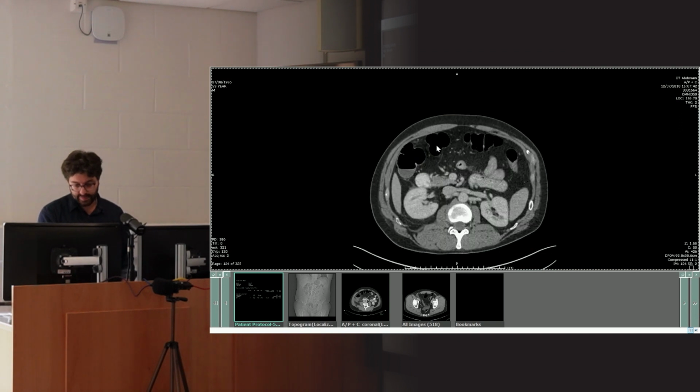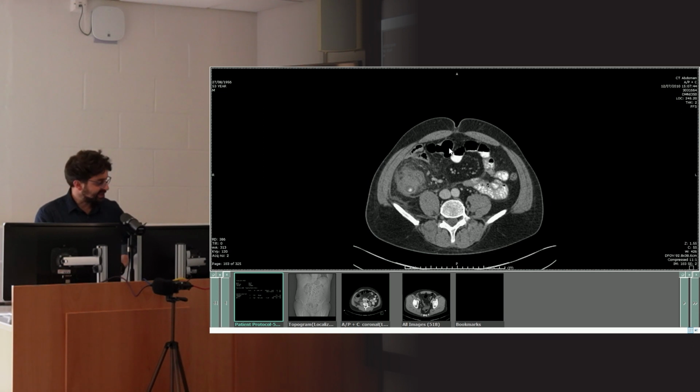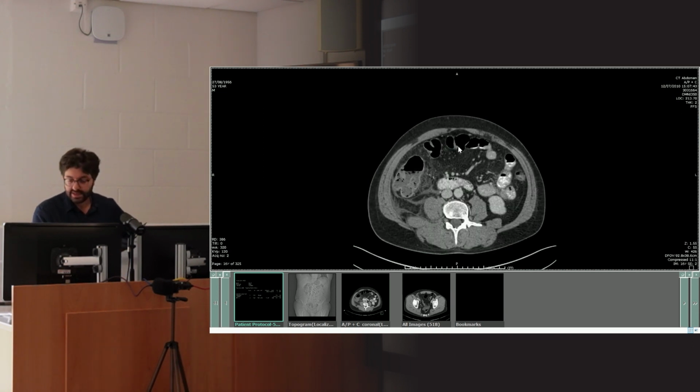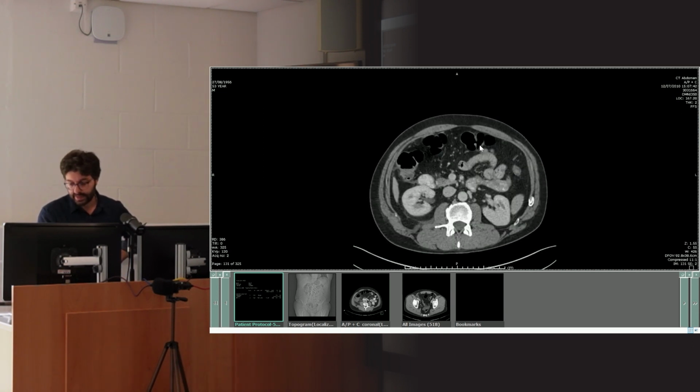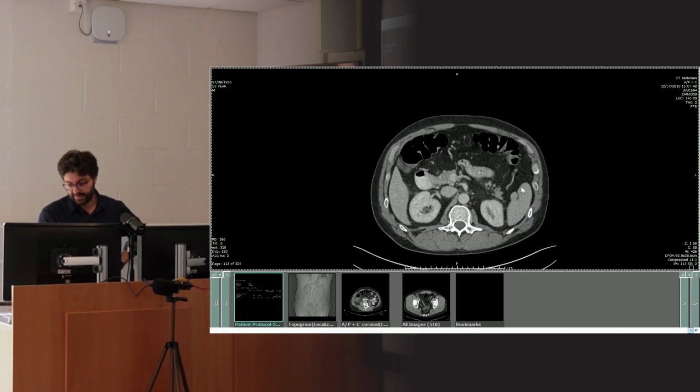If we're going to continue down from there, this is transverse colon, which, as opposed to what you see in the textbooks, is rarely ever transverse. Usually it loops down and then loops back up again. This is transverse colon going over to the left side, up and there. So splenic flexure, which is close-ish, just clean.